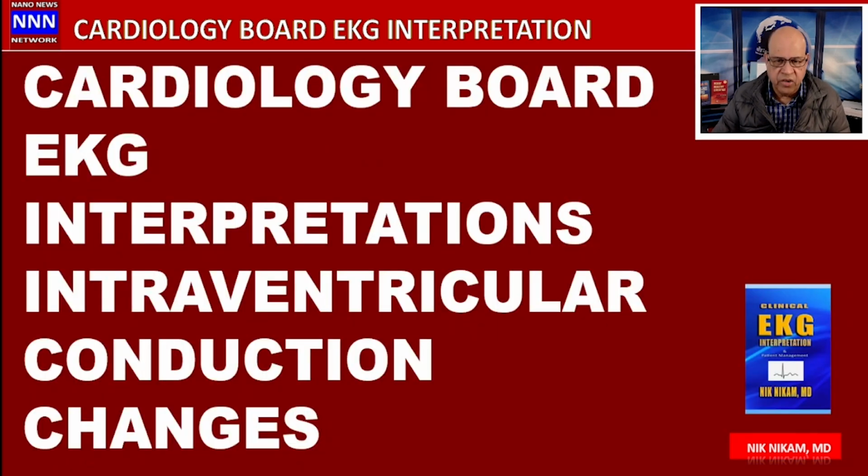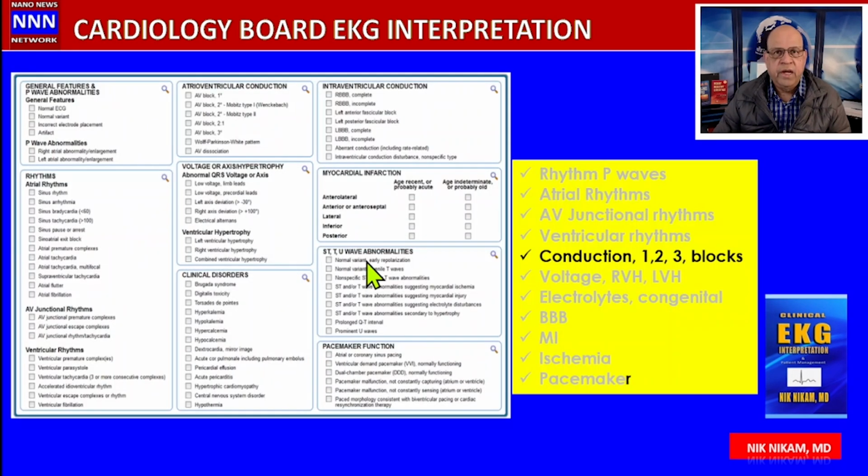The feature presentation is cardiology board EKG interpretations, intraventricular conduction changes. For those who are taking cardiology boards, you will be familiar with this answer key sheet used for interpreting the electrocardiograms. So we're going to use the same format to understand what EKG findings we need to be familiar with. You can follow these steps, then you will be as good as a cardiologist in interpreting the electrocardiograms, whether you're in the emergency room, or you're a primary care doctor, or you're seeing a patient in the hospital.